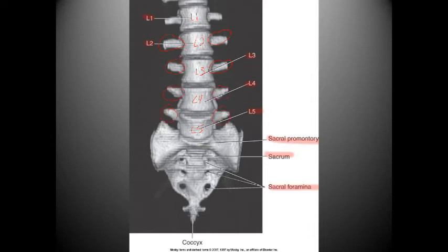And we have the intervertebral disc base, but one of the many problems with volume rendering is that when you focus on the bone, you tend to lose the disc, and so sometimes it becomes very difficult to actually demonstrate where an abnormality is, because when you're looking at a volume rendering, it's typically for bone or bony problems.